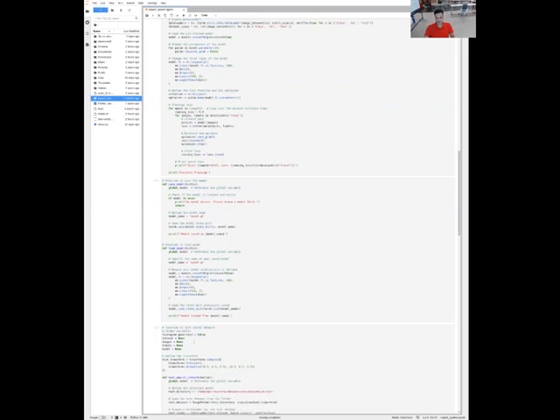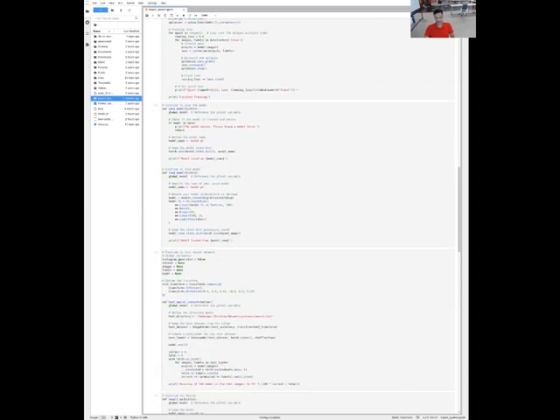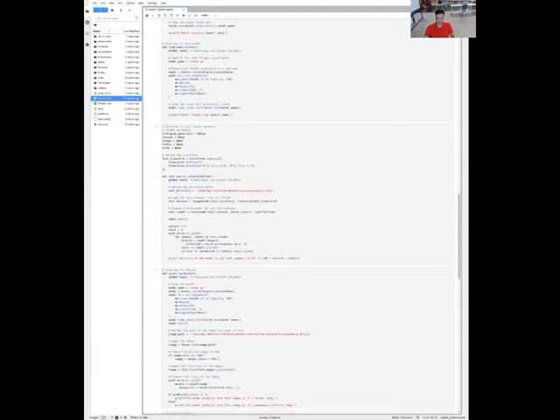And then the test neural network function: the dataset is loaded using the ImageFolder class and transformed with the predefined test transformation. The accuracy of the model is calculated by comparing the predicted labels with the ground truth labels in the test datasets. This function particularly helps us to test the neural network, so how accurate is our trained model?